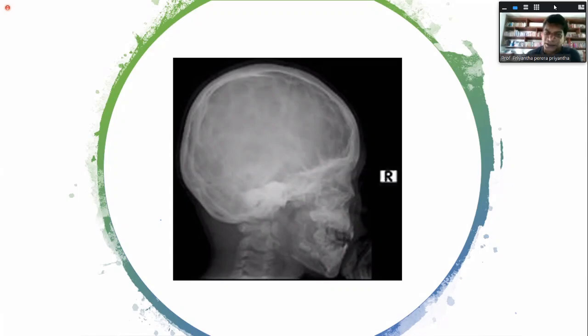The cause may be anything, but remember there is something called lacunar skull. These changes are seen only in part of the skull, which can be normal. So if you're not sure, get a radiologist's opinion. This appearance is not always indicative of hydrocephalus. The lacunar skull is more large areas like that, especially posteriorly, localized areas of this copper beaten appearance, right?